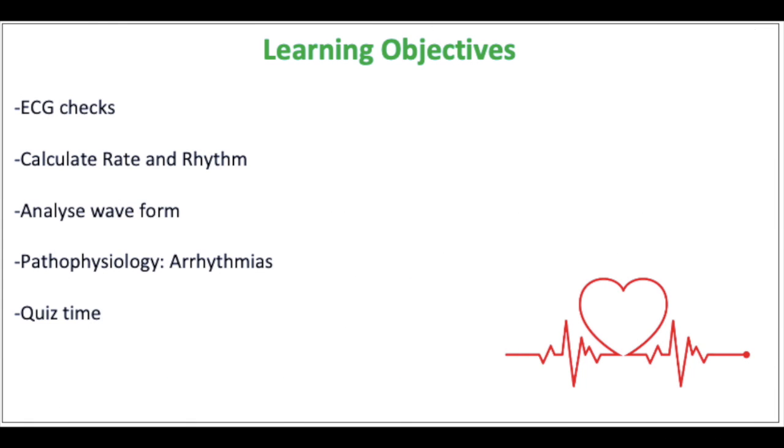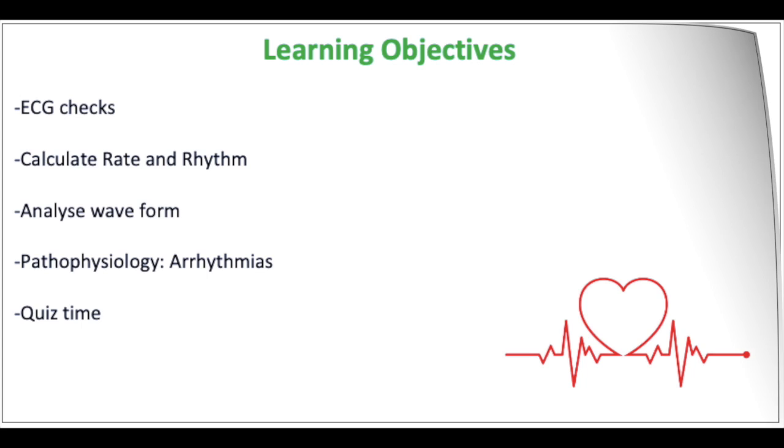In this 10-minute video, we're going to cover what to check on the ECG prior to interpreting, how to calculate rate and rhythm. We're going to analyse the standard waveform, and we'll then apply these concepts to understand cardiac arrhythmias, and finally, end with some questions to assess what you've learned.